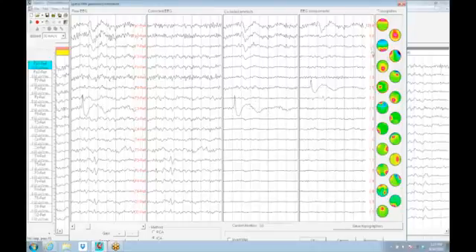So these are independent components that have been identified. And the PCA didn't do a good job isolating these because the PCA assumes a Gaussian distribution. And although there are people that will argue that the EEG is Gaussian, and it's actually fairly evident that it's not, the one thing I don't think anybody would argue is that artifacts are not Gaussian in their distribution.